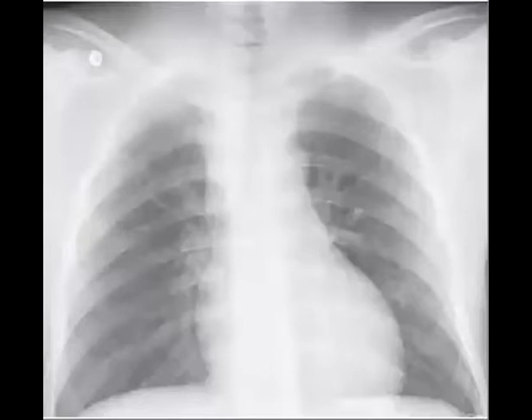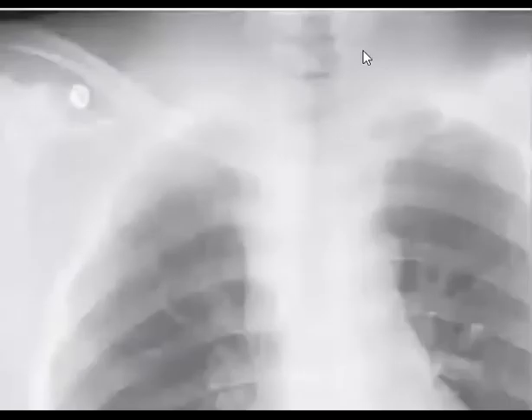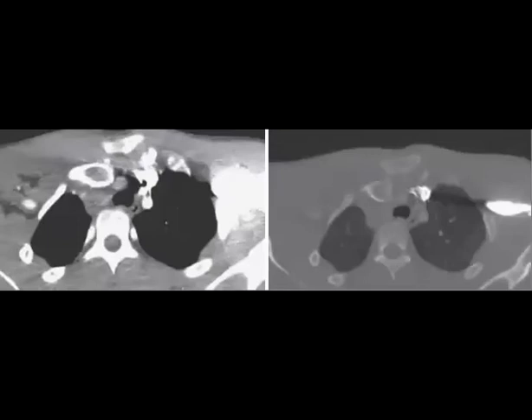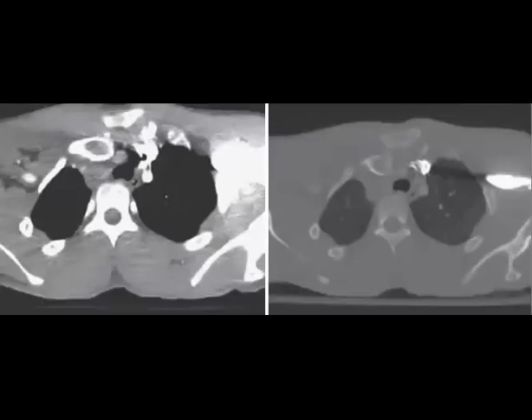This patient has what is called chest trauma. So this is the X-ray. I will show you that maybe it is not very obvious in the X-ray, so I will go to the CT directly because it should be a short case. So what do you think about here?